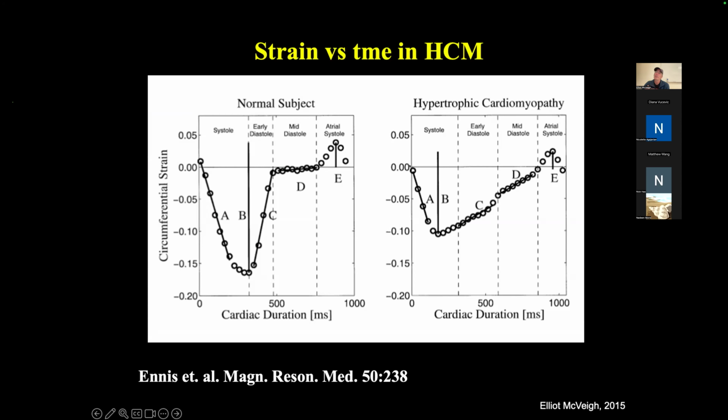These patients had hypertrophic cardiomyopathy of varying degrees, and a couple of observations. One, the rate at which their shortening is occurring didn't really change. I mean, this slope and this slope looked about the same. However, this cut off more quickly. So they only got down to about 10%, say at mid-wall, my circumferential shortening.